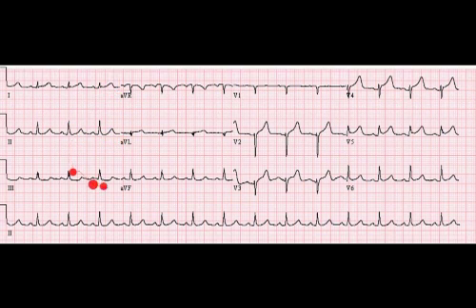The frontal plane ST segments maybe slightly depressed in lead 3. So I would say this is a borderline electrocardiogram with ST segment deviation. Rule out early repolarization, rule out pericarditis, rule possibly a normal, and that would be this. Good.